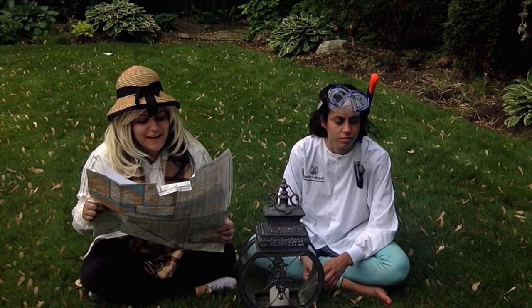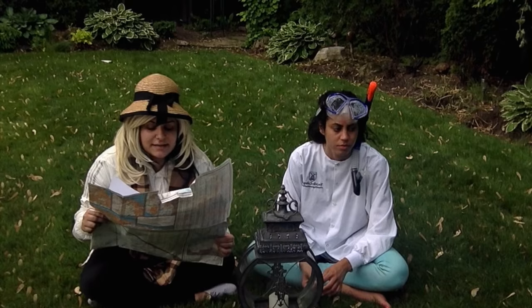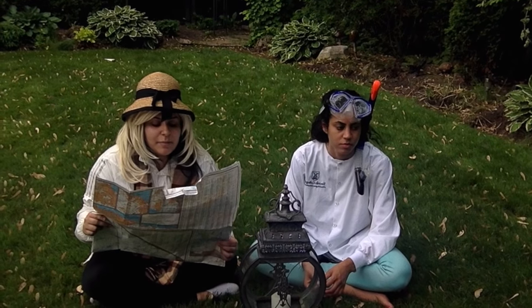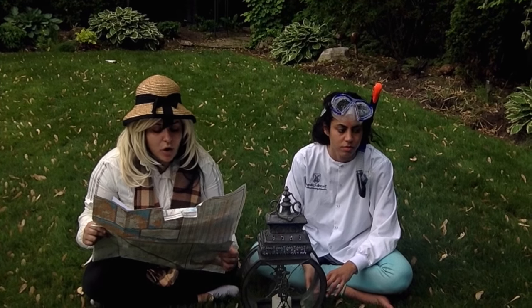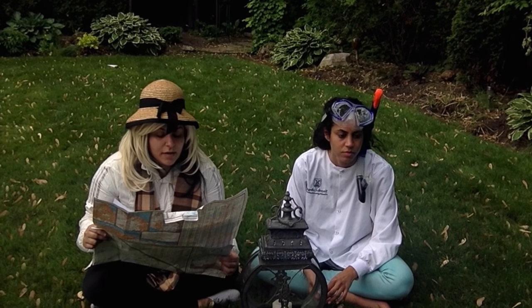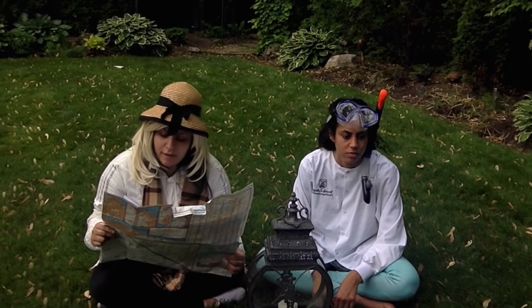Most of the cases are found just having a general dental checkup or a regular radiographic examination. This condition can happen all over the mouth or just in one specific area. Teeth affected are always vital, and the root is always the part most affected. The root looks bigger than normal and very round.